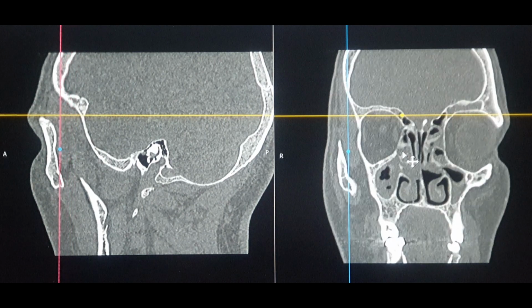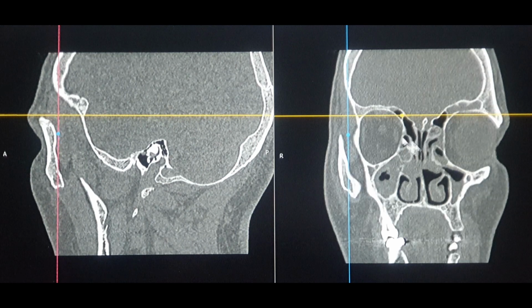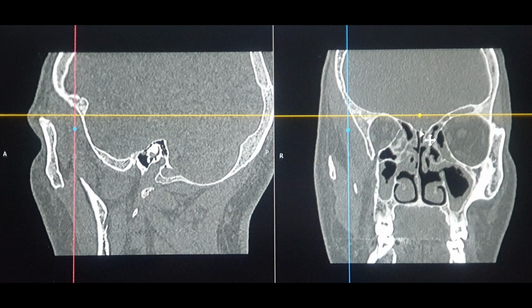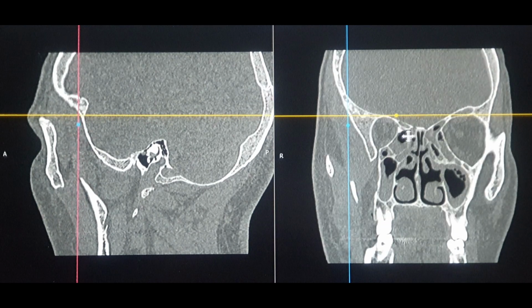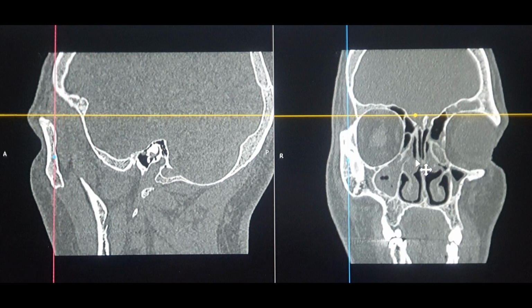Unlike the skull base in the anterior ethmoids, which was oblique at a particular angle to the lamina papyracea, after we cross the ground lamella the skull base is almost flat and horizontal. That is an indication of the posterior ethmoids, along with the fact that the posterior ethmoidal cells are larger and fewer in number compared to the anterior ethmoidal cells, which are small in size but quite large in number.